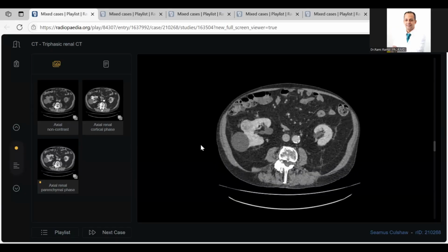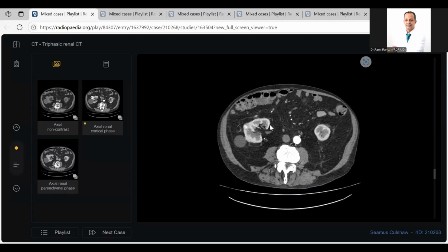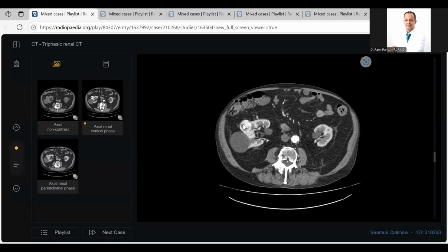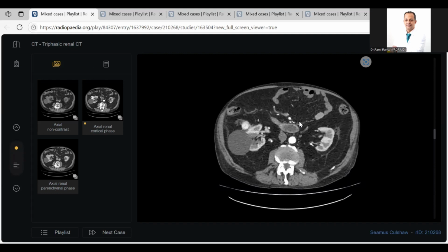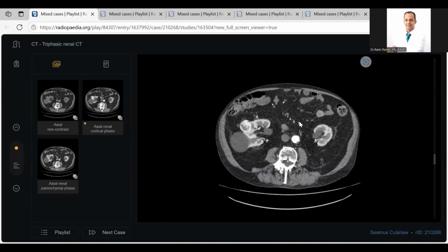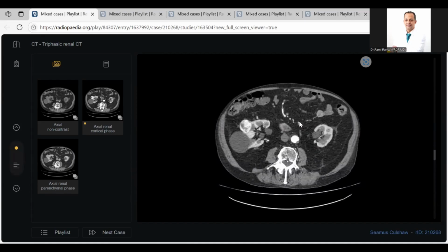Doctor, are you sure this renal lesion, this markedly hyper enhanced lesion, should be biopsied? What is in your mind? Tell me what it could be in an 85-year-old male patient. Sir, what is the first differential diagnosis? Markedly hyper-enhancing lesion with central necrosis in a very old patient in the kidney. I suspect malignancy.